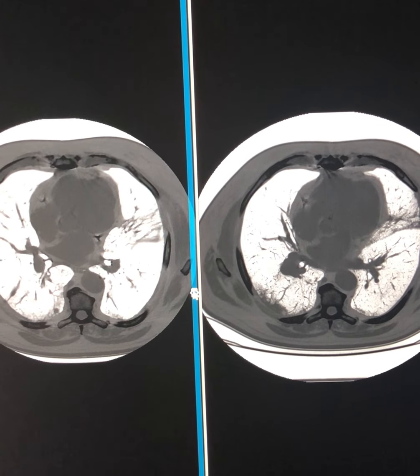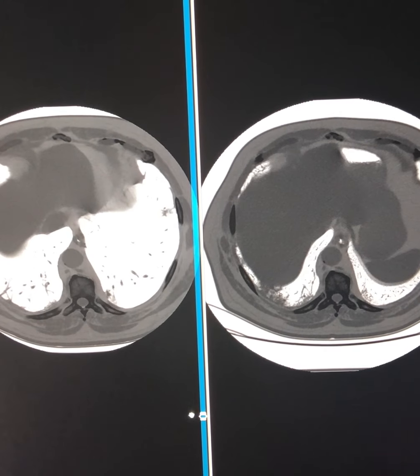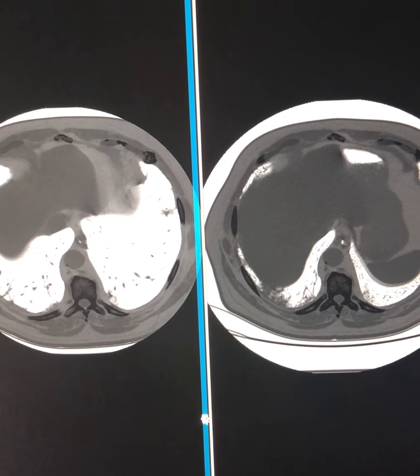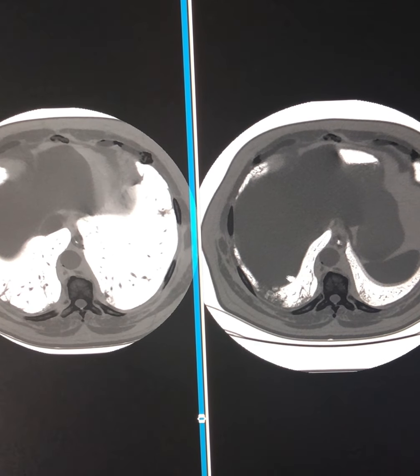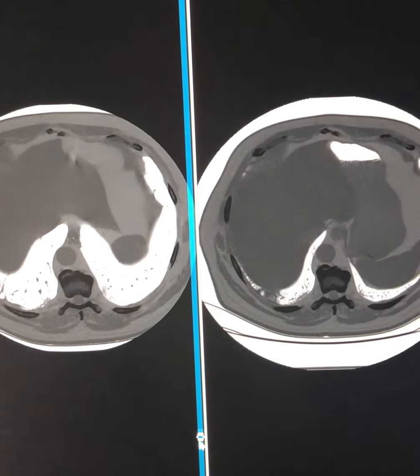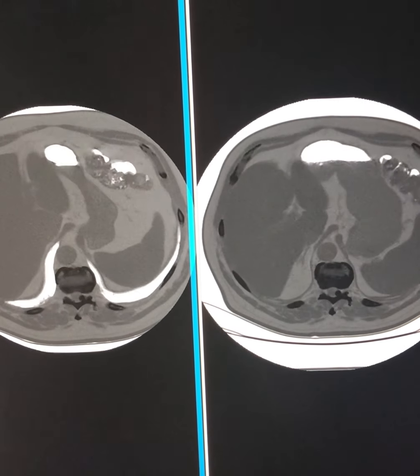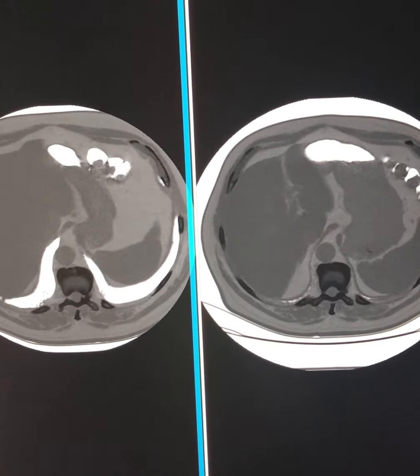Finally, when you go to the extreme base, you can see that the lung disappears here, and there's a large part of lung left at the base due to greater inspiration. Here we have, at approximately T12 level, the liver occupying most of the image, where you have to go down several vertebrae below, where you can still see lung occupying that area.